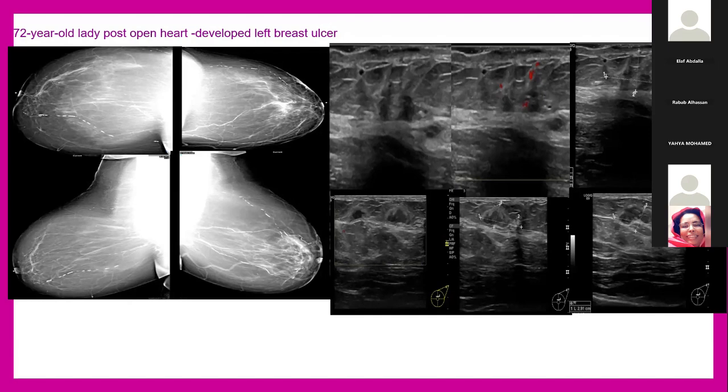The patient had been seen by the technologist, and she came and told me this patient has nothing in her breast. Okay, and if you look at the mammography here, you can see there is some asymmetry. Okay, there is asymmetry compared. She has fatty breast, but in the right breast, I can see this asymmetry at 12 o'clock. It was not seen in the contralateral.